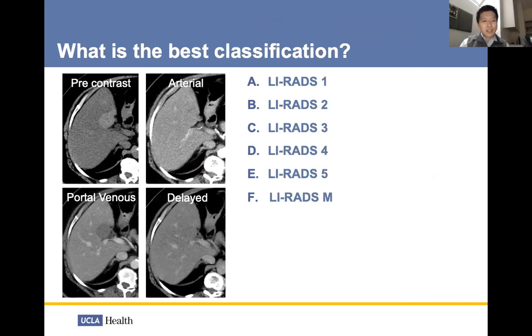So the answer here is it's more like an FNH. Wait, oh, just kidding. Sorry, I take it back. My bad. It looks like it wants to be something benign. Yeah, it looks like it's got pseudo-washout, like it's bright on the pre, and then kind of equivalent on the arterial, and then on the venous, I wouldn't say that's washout because you don't have the arterial hyperenhancement, so it's like pseudo-washout. Yeah. So some kind of focal fatty sparing.